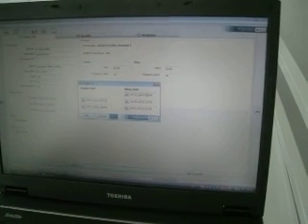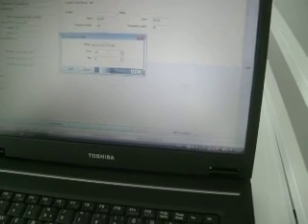So you should ask the patient when she really went to bed, and if it was, for example, at 2100, click here, and if it was at 2100, you can change it here and press OK.